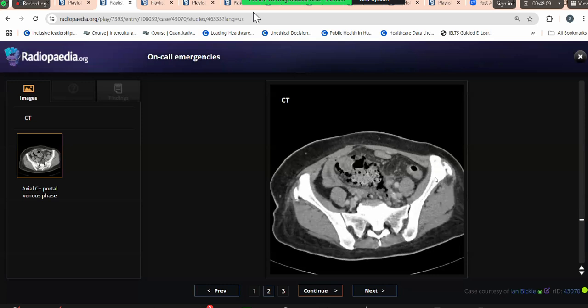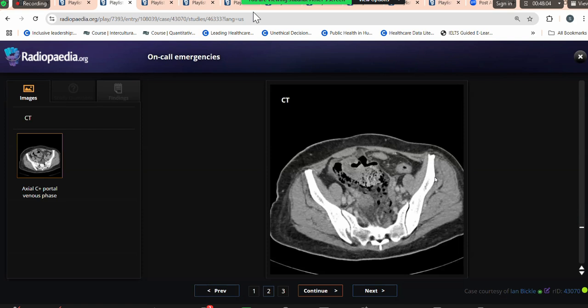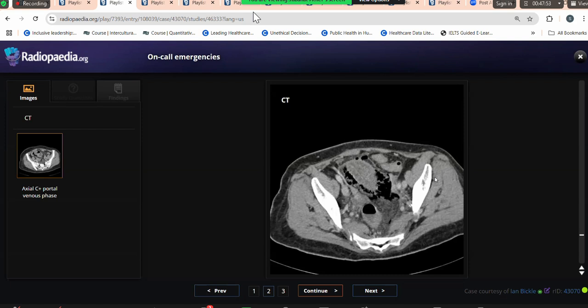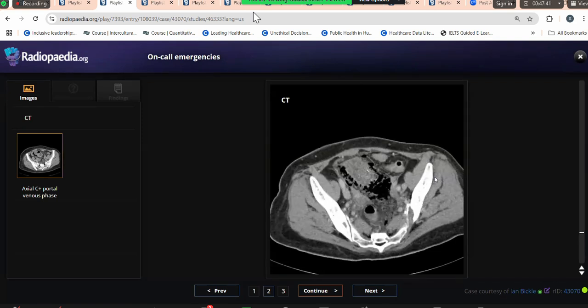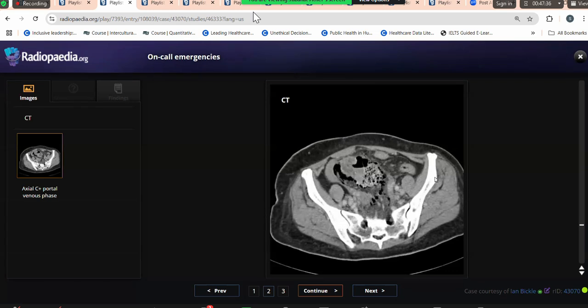The rest of the large gut shows no evidence of obstruction. For these imaging appearances, as the patient has presented with acute abdomen, I would also look at any previous history or imaging, and I would be considering acute diverticulitis with wall perforation and free intraperitoneal air. We cannot see any diverticula at the moment. What other possibility can there be for these imaging features?